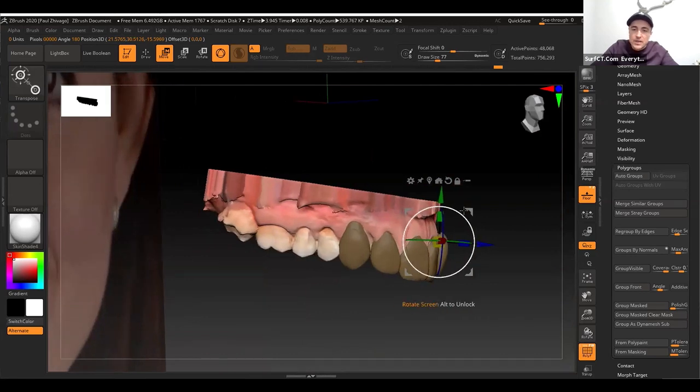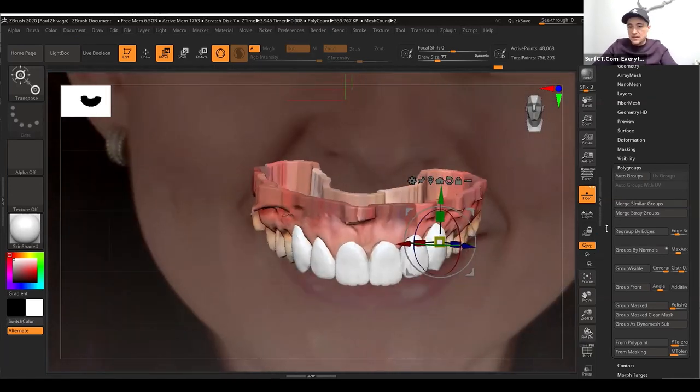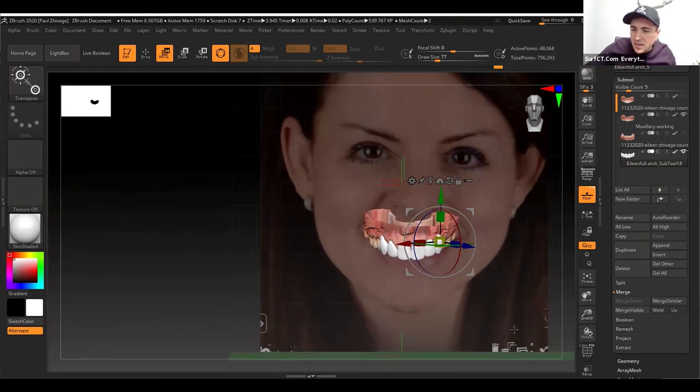So this is now really up to you how you design it. Let me unselect this. Also the color is not what we want. Now you can also export this to the printer. So I understand that this is not perfectly aligned, and I would like to have a Q&A session at the end, because I believe there was a lot of information, and whoever has any questions and so forth, we can go about that as well.